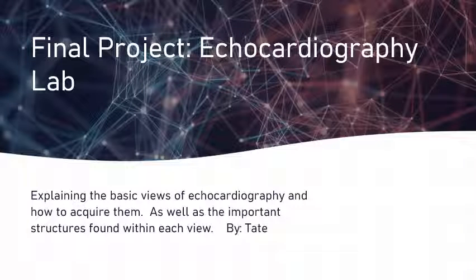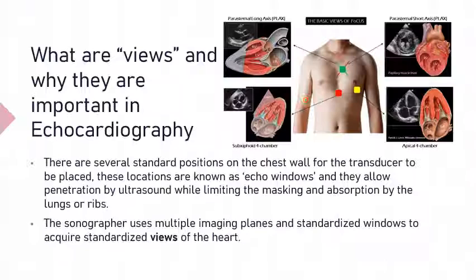Today we're going to be going over echo views and the important structures within each one that you'll be able to see. So what I mean by views, here's some examples that we'll be going over. It depends on where on the patient's body you put the transducer and important structures you'll see within each one, and these are known as views.